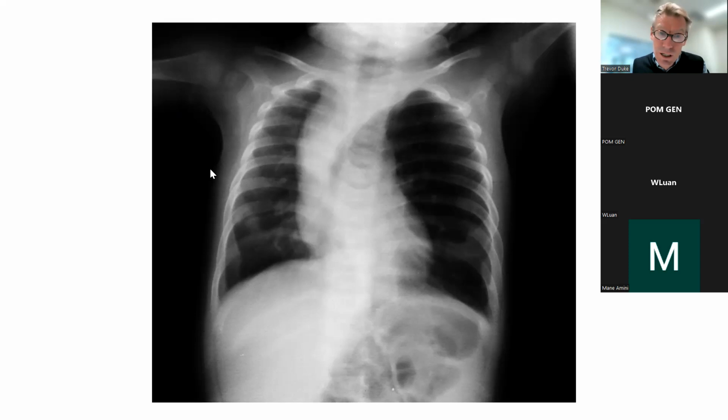So here again, you've got asymmetry. There's not symmetry, is there, of this X-ray? You've got a right lung that looks reasonably normal, but the mediastinum is shifted right across. There's maybe a little bit of rotation to the right, but not that much to explain the right-sided shift. But you can outline the left lung, and you can see the left lung pushes all the way across to the right. In fact, the left lung is pushing the mediastinum across to the right, isn't it? So what could be going on here?